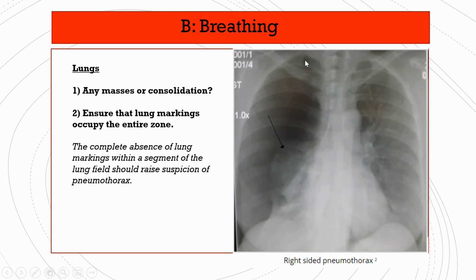There are no lung markings at all here, can you see? Here, there's some little filaments. It looks like little roots. And then bam, on this side, it's just completely unified. It's almost too black now. And what is this thing here? It is the lung that has actually collapsed right down to here, okay? We call it right-sided pneumothorax, and it's a severe pneumothorax in this case, right?